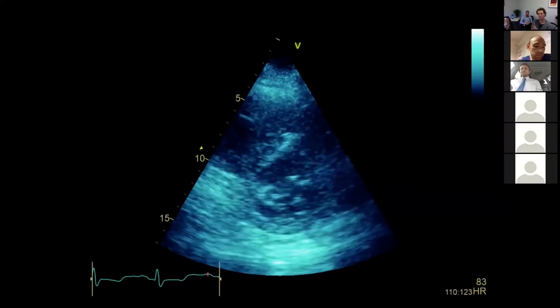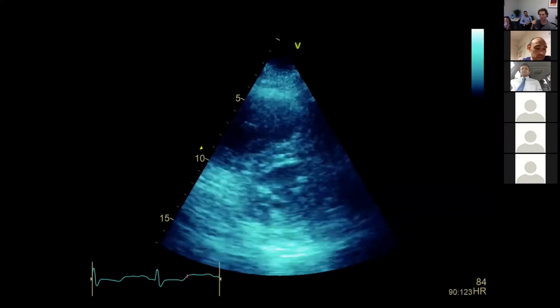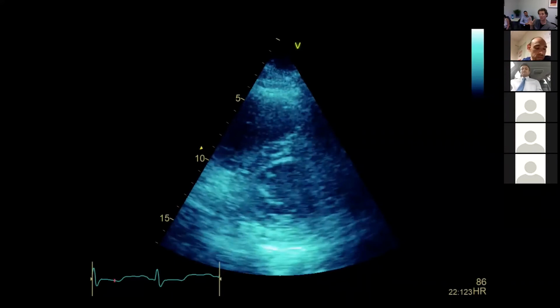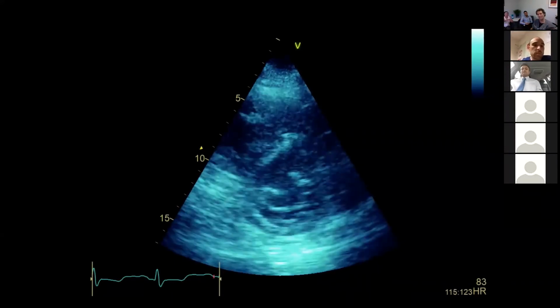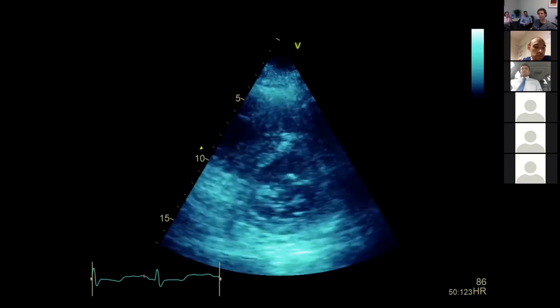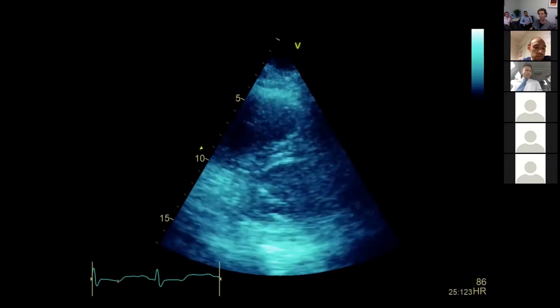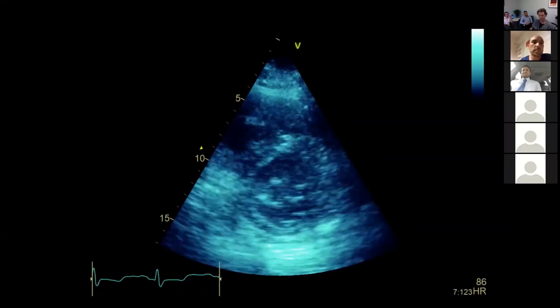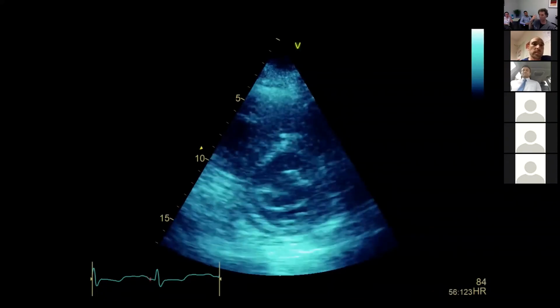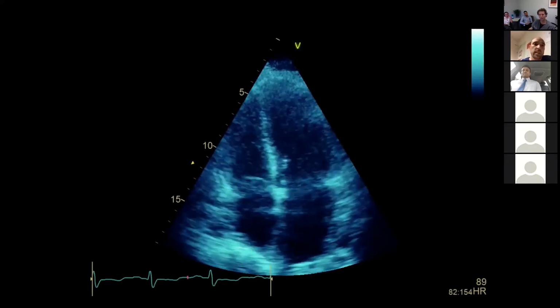And well, I think this is a really beautiful example, and it was demonstrated really nicely in a lecture Vishal gave on mitral regurg. You've got to remember that each papillary muscle gives attachments to both leaflets. And so this is the anterior mitral valve leaflet that's just flopping around all over the shop with the flail, and it's leading to a posteriorly directed jet. It reminds us that the papillary muscles supply both leaflets of the mitral valve.